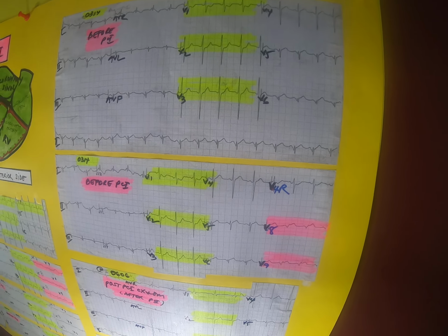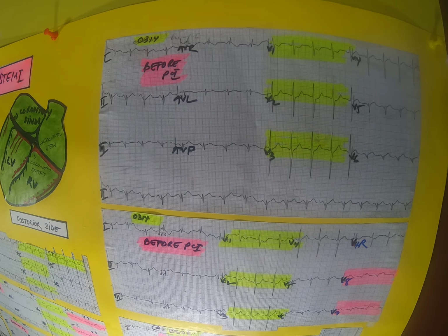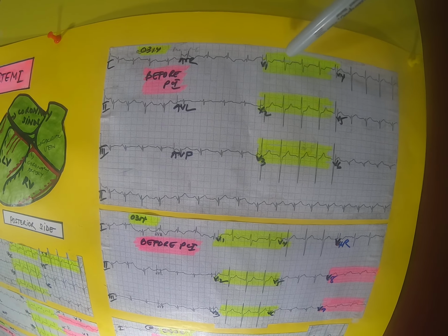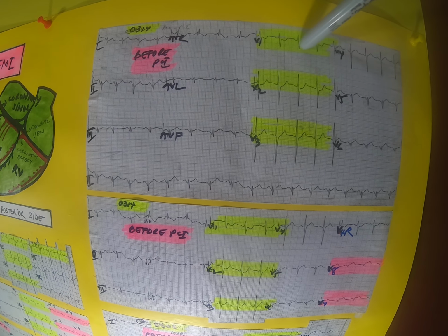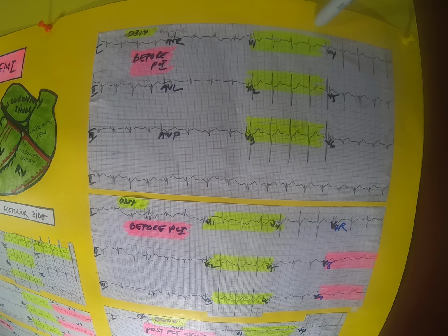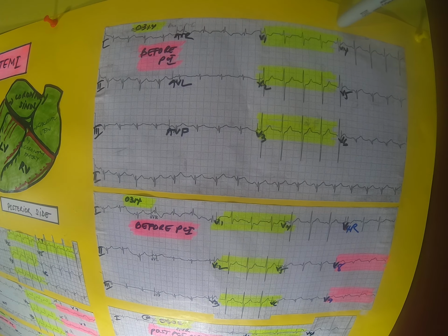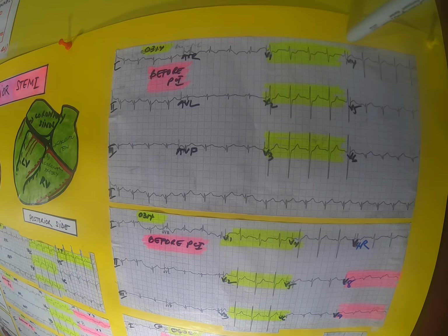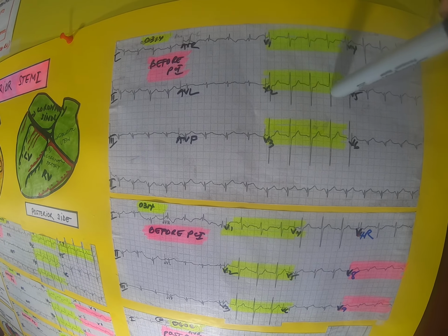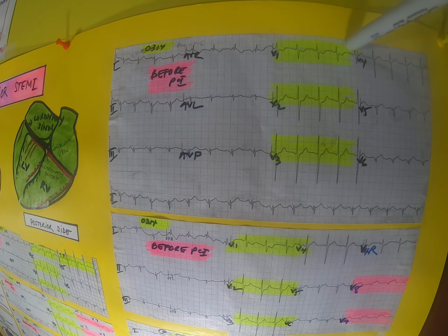In the holding bay, they did two sets of ECGs here. The basic ECG is sinus, but the ST depression subsided a little bit, and that is probably a little bit of help from the medications given earlier, like antiplatelets, vasodilators, venodilators, and pain medication. These medications can reduce the demand, and the antiplatelet may be taking off a little bit of any existing thrombosis, if there is.